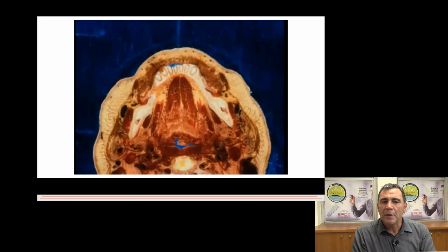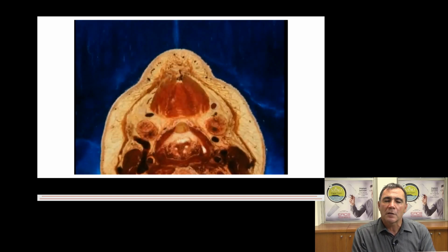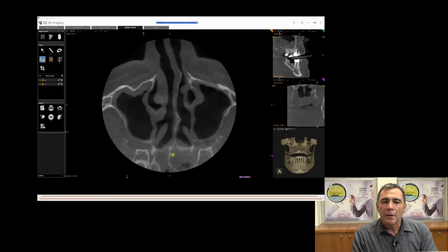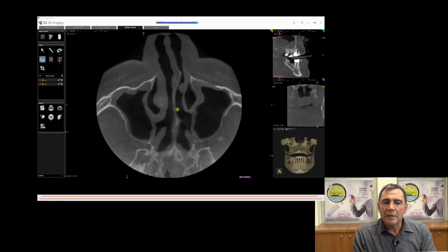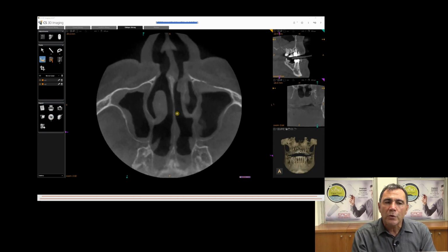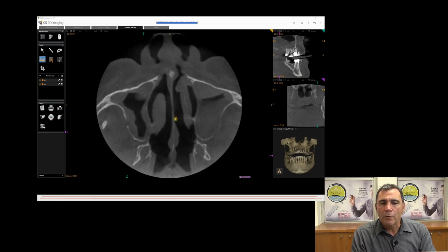That is the anatomy, and you can just to remind you back of your anatomy classes of all the muscles, all the structures that we are going to go through. And this is then how I start. I look at the septum, I look at the maxillary antrum, I look at the vertebra. Okay, and this is how I look. And on the mouse you'll see it getting orange. That is how I go from superior to inferior and looking at any problems that I can foresee.